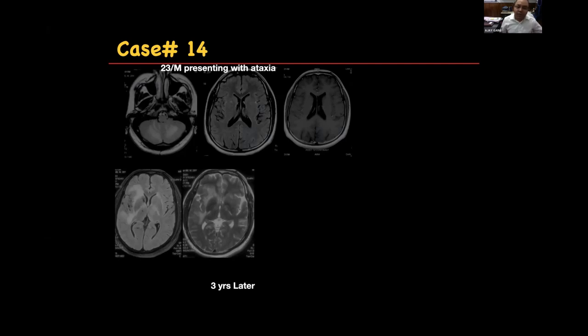After 3 years, this patient presented with hemiparesis. Left side. Can you describe the finding in this? So, in the 3 years later imaging, we can see in the FLAIR image there are areas of hypointensity surrounding a perilesional edema, hyperintensity could be edema, and in the T2 image it is also looking the same. There is perilesional edema with some lesion, supposedly could be a mass lesion. Mass lesion, but don't say much mass effect.